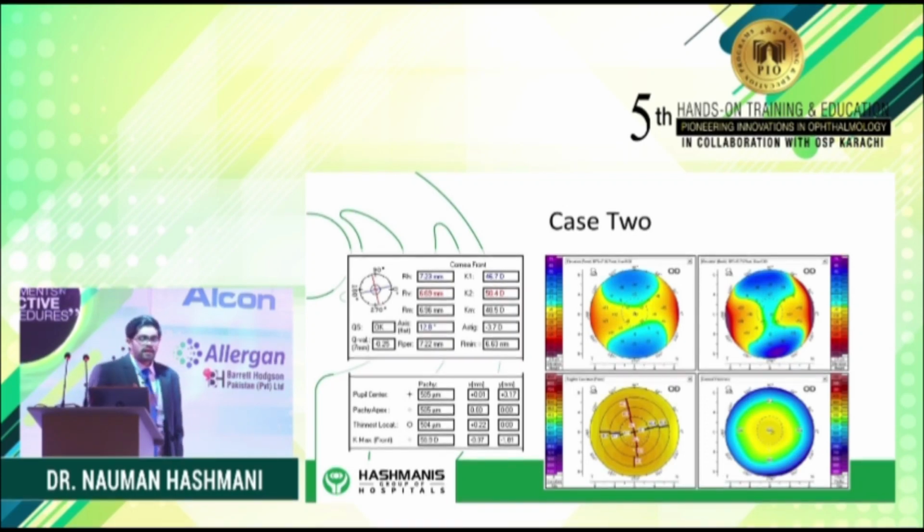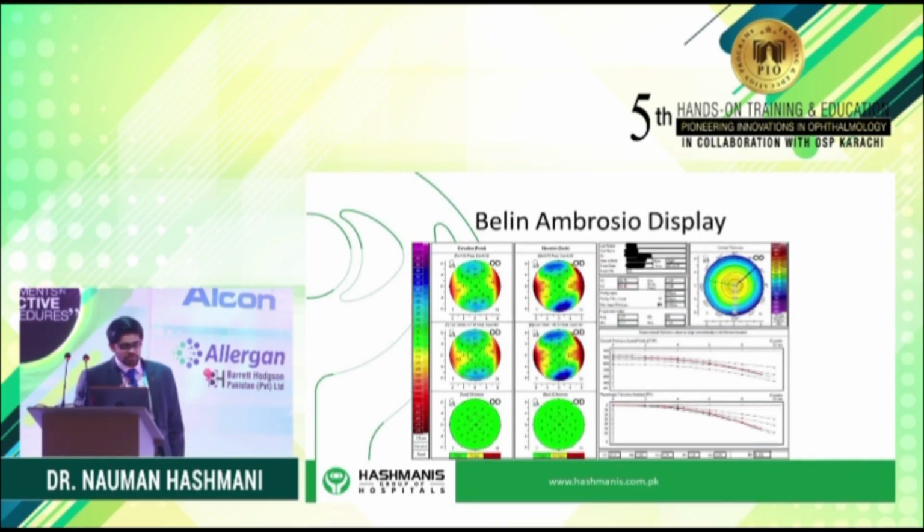Alright, so this is the Belin Ambrosio display that we can look at on the Pentacam. Now if someone is working on the Galilei or the Sirius, I don't think this display is available to you, but it's a very good thing to know because it's an amazing display.